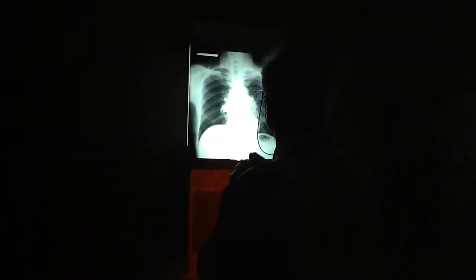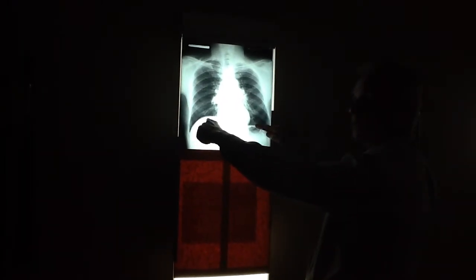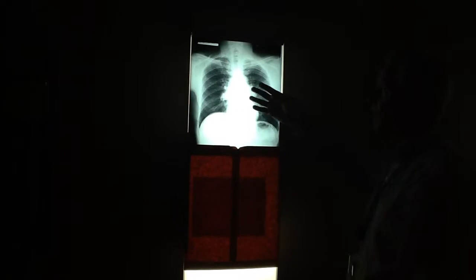And some of these look very faintly like they may be calcified. We can almost get a bit of a ring shape to these. Some of these here have a bit of a ring look to them. And there's also, wouldn't you say, the lungs look like miliary nodules? These are not normal lungs. Very faint, bilateral. This is somewhere in between our early and intermediate.